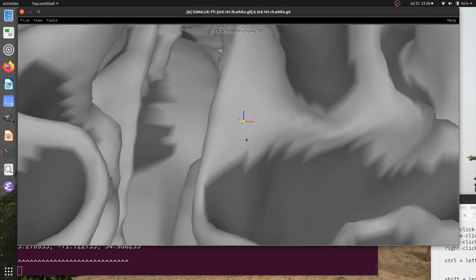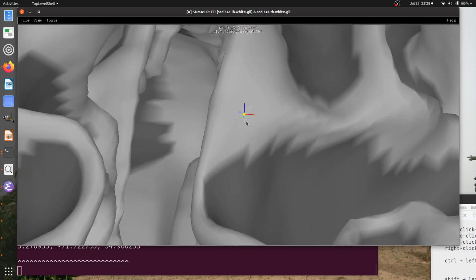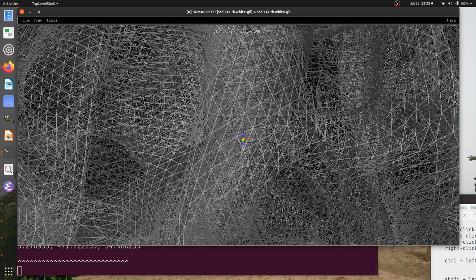And if I zoom in here now, what this triangle is, so see this triangle and I'm going to hit the P key, you'll see that this triangle that's highlighted is just showing me the triangle within which I happen to click. And this purple dot, if I move around, you can see it's actually the node that's closest to wherever I'm clicking.